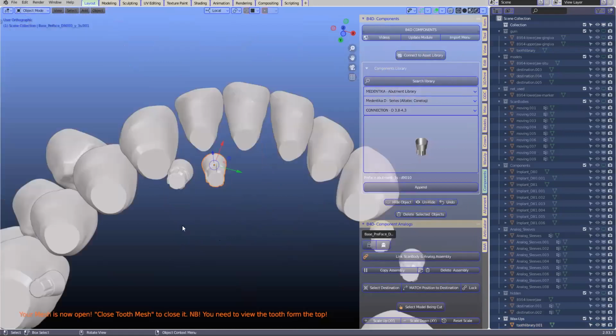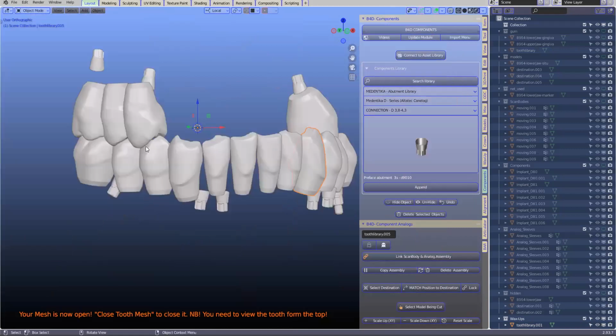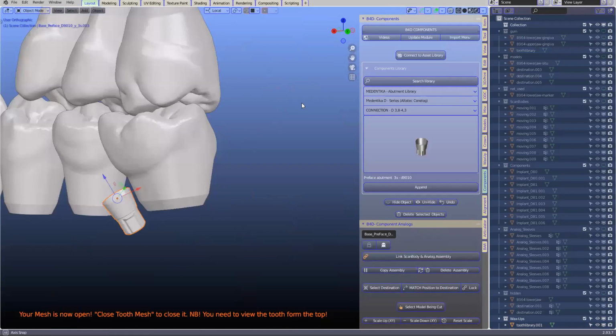So these implants have not been placed with a surgical guide. It's quite evident. Here, for example, we've got the molar. And okay, maybe the bone availability in this molar we can understand, so we can bend this across. Not easy.